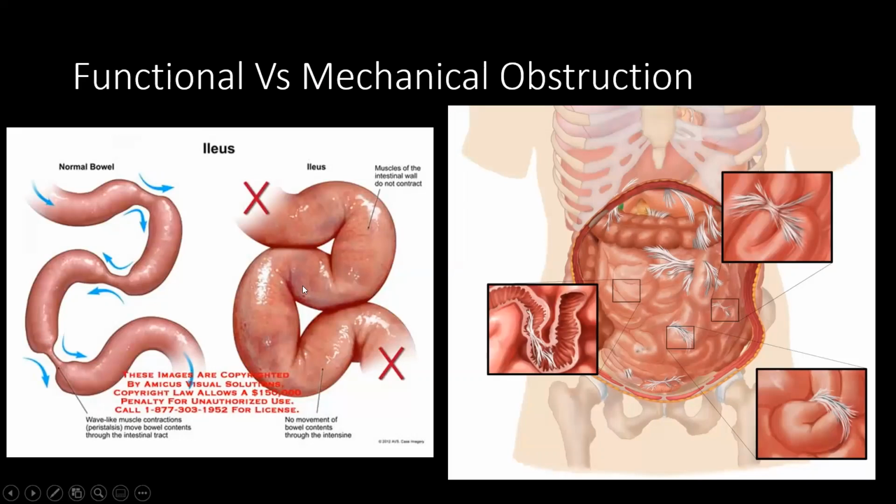When the bowel all in all is not moving, I call this an ileus. So ileus is a functional obstruction, if I may say, of the whole bowel.